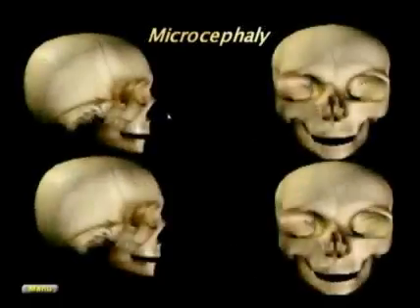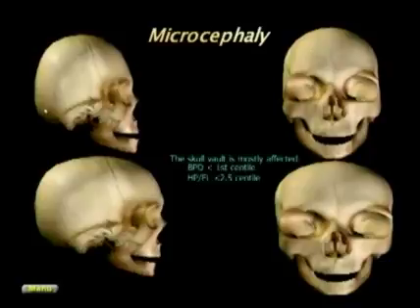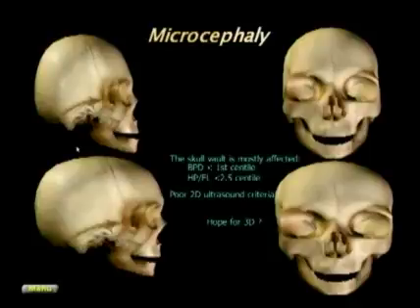Microcephaly is a condition in which the neurocranium is too small compared to the visceral cranium. In the old days, this was a very tedious and complicated technique, and the criteria that had been suggested were a biparietal diameter less than the first centile, and you see the biparietal here is affected, but is not quite as much affected as the cranial vault, head perimeter over femur length, and so on and so forth. But they were very poor 2D criteria.